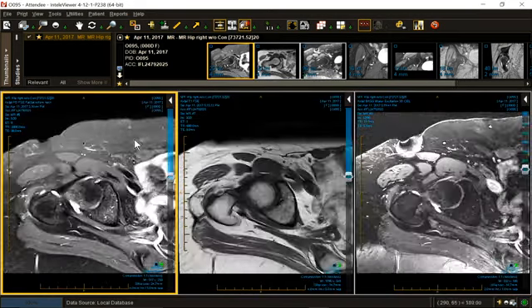Let's blow up our sagittal. Some of that signal is in the bone. Some of that signal is out of the bone. So cystic degeneration, or IOG, in the bone, and pseudocyst formation outside the bone. But look at that labrum. It is macerated. There's a horizontal tear. There's a longitudinal tear running along the long axis of the labrum. It's curly Q. It's kind of scrunched up instead of a nice, well-formed triangle. Game over. You can keep going, and we will, but there is a large labral tear.